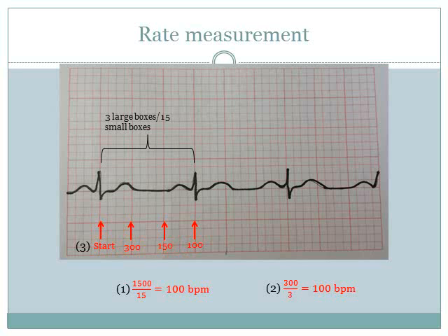As I said earlier, I drew this ECG in a way that it will be obvious to you, but in the real world it's not like that. So you always come up with the best number possible.